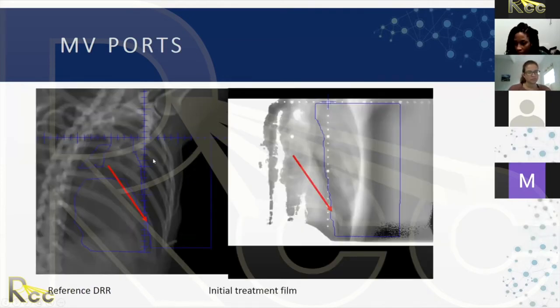Okay, this is that same patient that I was showing you. So we're treating the chest wall in this area. This is the tangent field. And the thing that I wanted to point out here, here's a lateral view. You can see our block goes down this way and essentially covers the heart, right? So our heart is blocked out. What you can see is that the rib is right on top of the block.